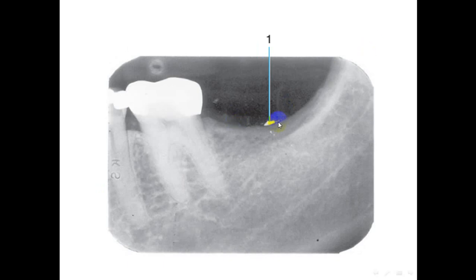Here, this is an amalgam fragment embedded in the soft tissue, probably left after an extraction.